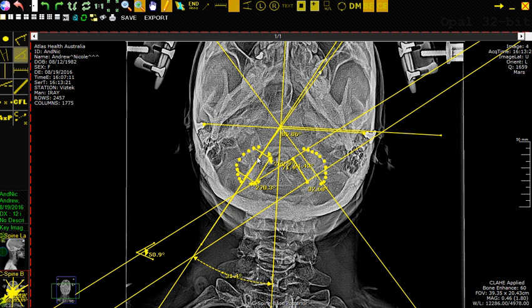So what this means is that the left skull C1 joint is sitting at a 31.4 degree angle for this person. That is their individual normal bone structure, and that's the reference that we need to take into account in order to determine what's abnormal versus what's normal and determining what to adjust.